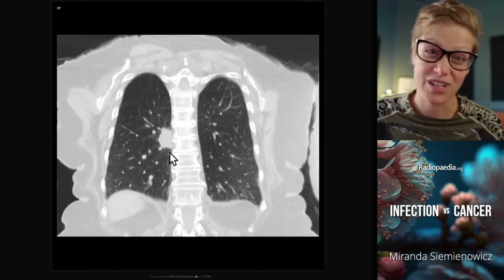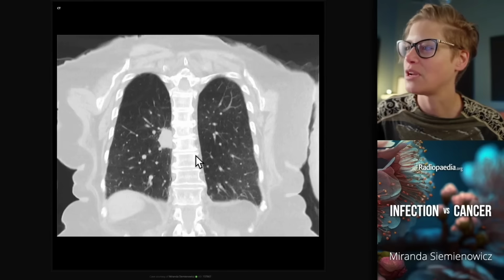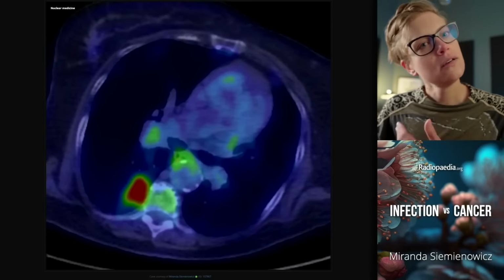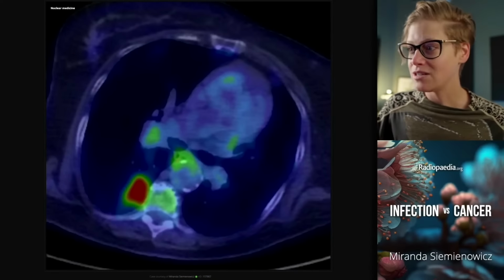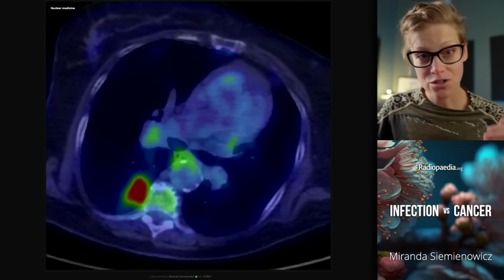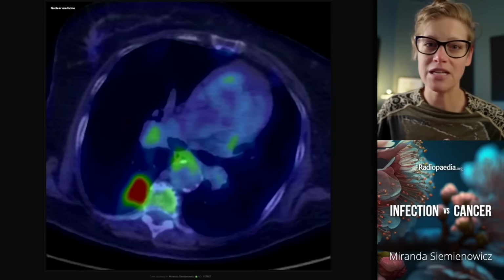I think this is 2 secondary pulmonary lobules abutting each other. They are filled with consolidation, and this is a very clear benign morphology. So what happened? Somebody got upset. They did a PET. It doesn't help. Highly metabolically active lesion, but with that morphological information from the diagnostic CT, you can direct the referrer and know that empirical treatment with antibiotics, follow-up CT is the way to go.